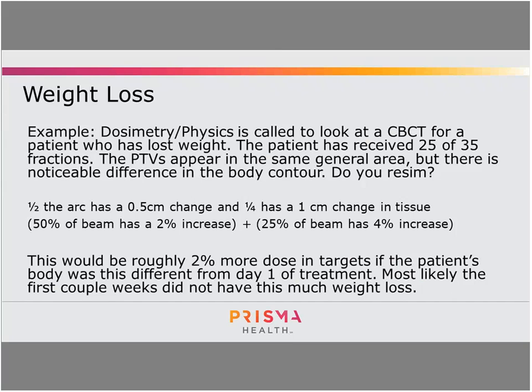But that doesn't mean the patient has been like this since day one. So one thing that's important to do is to try to determine where this change has happened, and to monitor whether this change is increasing. And if you're doing the split field technique, it's very useful because when you're looking at weight loss, you're thinking about max doses to things. And the cord is pretty much going to be shielded, and the cord is normally in a similar spot. So the cord's not going to really be increasing by that much.